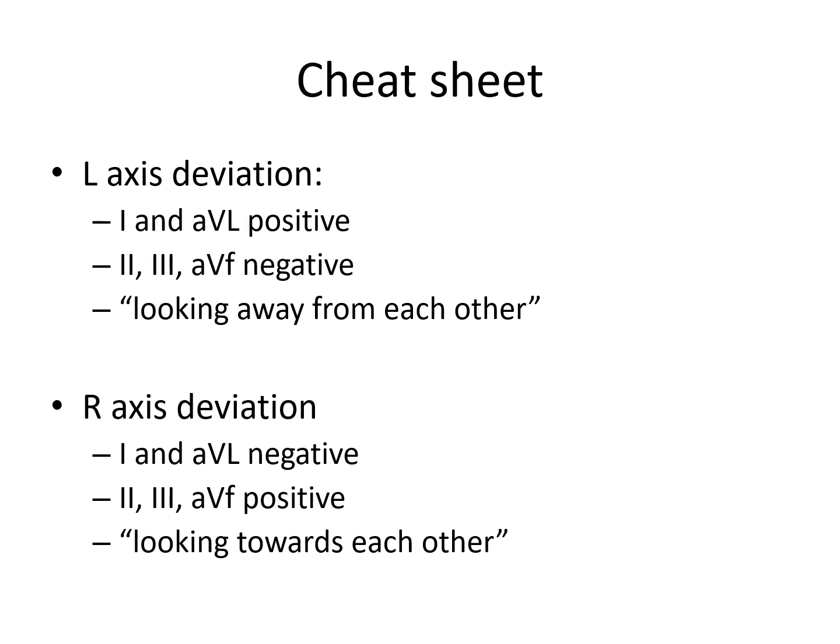As far as hypertrophy, again, just remember that in the left ventricular hypertrophy, the left-looking leads become taller and upright, and the right-looking leads become taller and negative. And with right ventricular hypertrophy, we have an overall shift of the axis towards the right. As far as the bundle branch blocks go, remember that you need all 5 criteria to diagnose the left bundle, and for the right bundle you will see positive deflections in V1 and V2, and you will see a very prominent RSR prime, with a second peak being the bigger of the two.